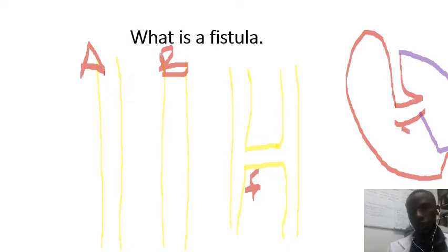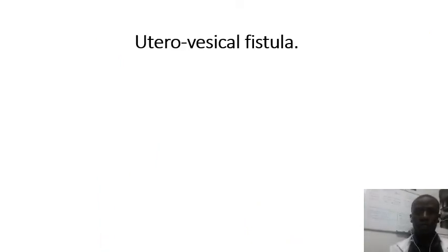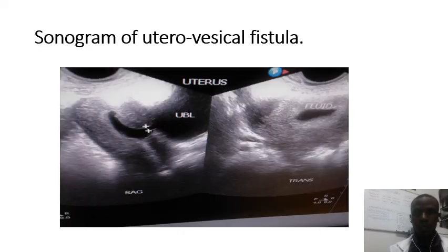Okay, so this being my image, I was saying this one being the uterus, and then this is the urinary bladder. Hope you can appreciate this image. Alright, so on ultrasound, what you find, hope you were following: we know that the urinary bladder always has an aqueous fluid, which is urine, and so it borders the uterus on its anterior aspect.